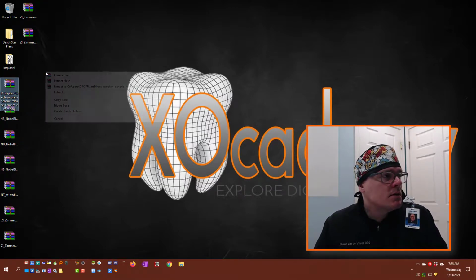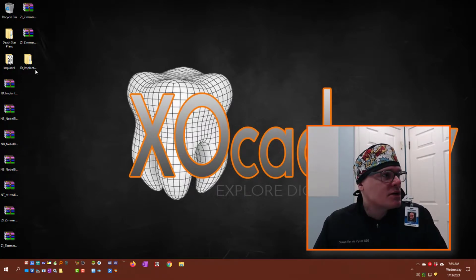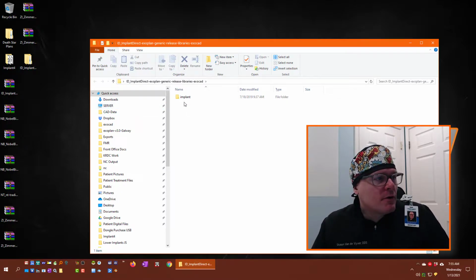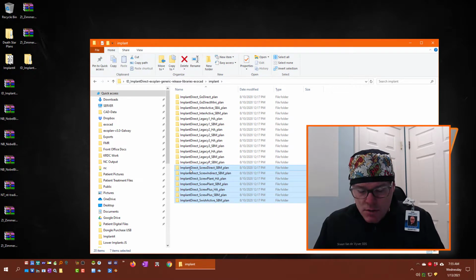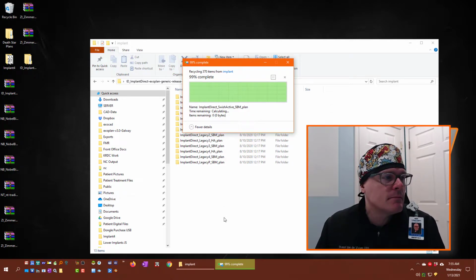So I'm going to extract that to the desktop, and we have this extra folder here. When I look in that folder, I see another folder called Implant, and then all of the Implant Direct libraries. So we have Go Direct, Interactive, Legacy, Swish. So I'm going to just delete the ones that I don't use, because I can always download these libraries again later on.